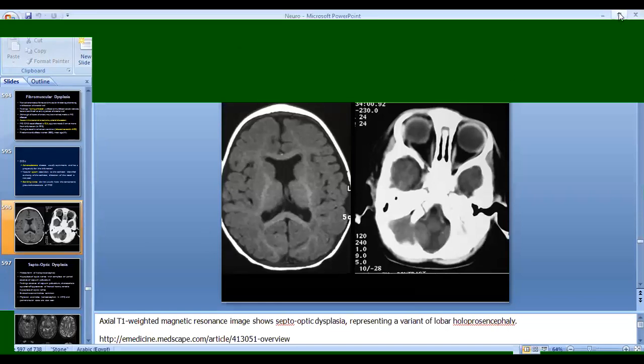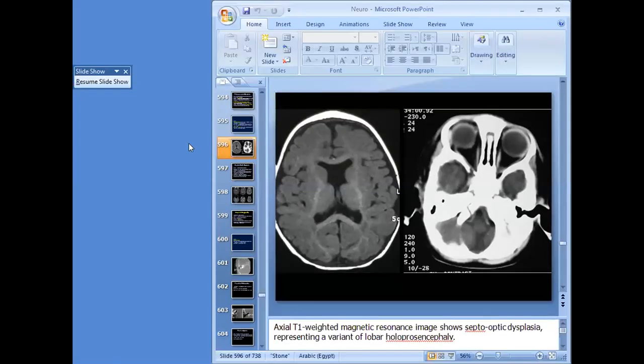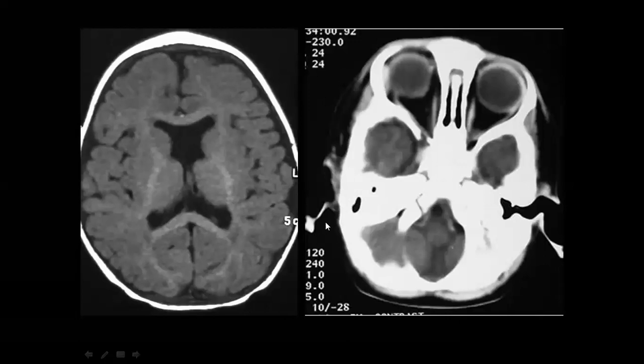This case anyway, yes, it is solved. Can you see the answer in this case? I can just check with you. Okay. So this patient, we're talking about something related to the congenital, right?